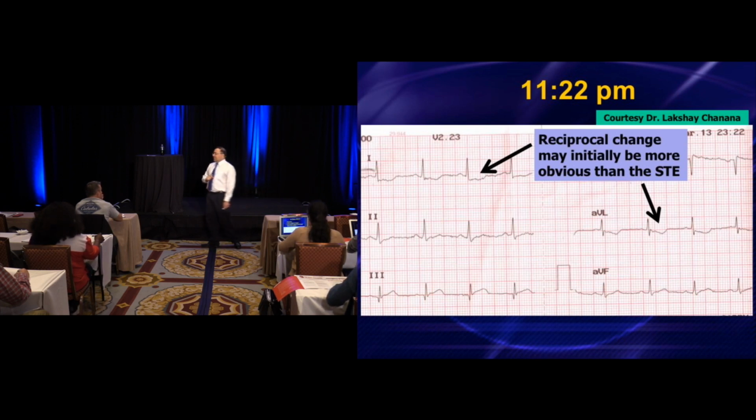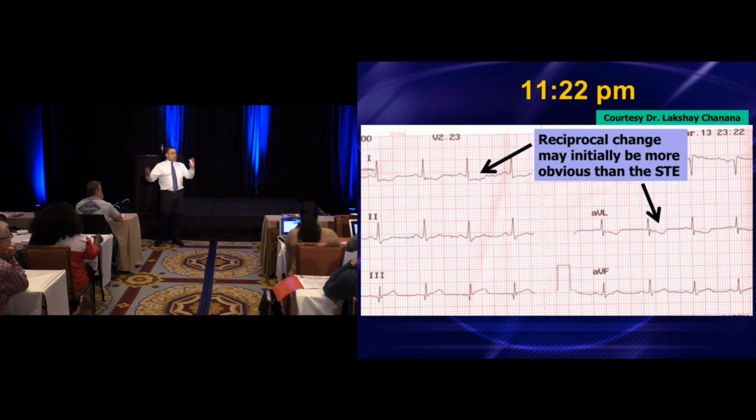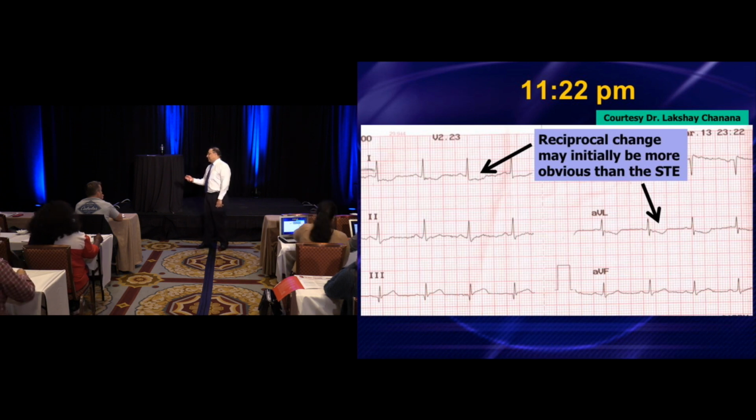Did you notice that there was some ST depression in AVL? And we're going to spend some time talking about AVL. It's one of what I call the Rodney Dangerfield leads, right? Remember Rodney Dangerfield, famous comedian? What was Rodney Dangerfield's famous line? I get no respect, right? Well, if Rodney Dangerfield were a lead on the 12 lead, what leads would he be?